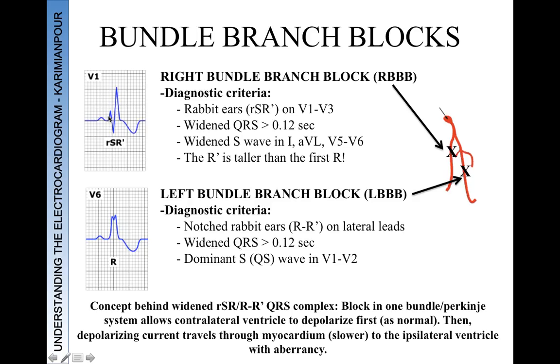So the way that I remember that is that the R wave on the right side in a right bundle branch block is taller. And when we talk about ventricular tachycardias, sometimes that helps us differentiate between SVTs with a right bundle versus a true ventricular tachycardia. So this last point here is actually important to remember.